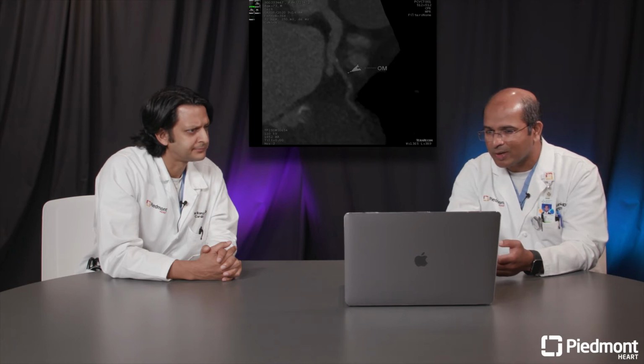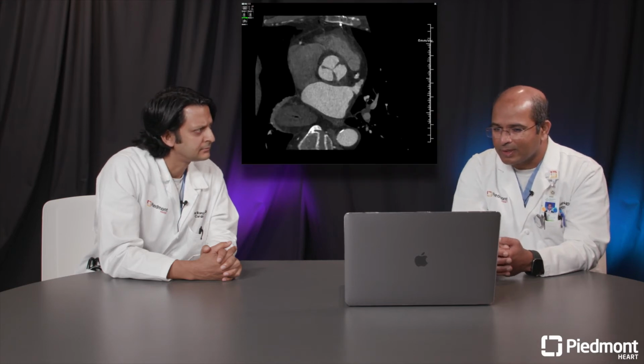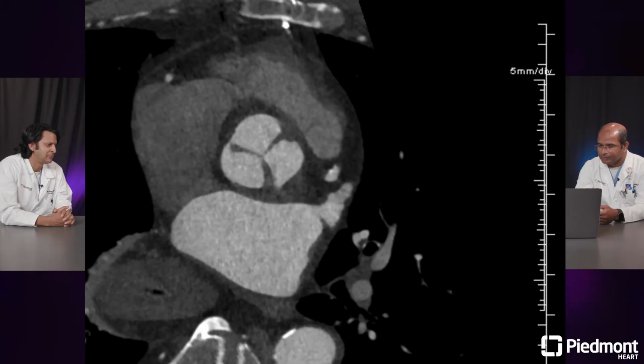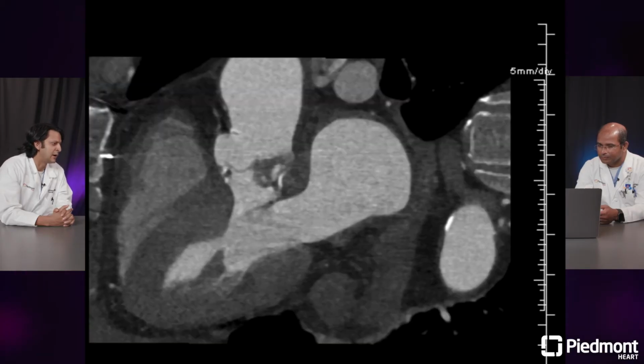And the second case you have here is another bioprosthetic valve, I think, too, right, Vibhav? That's right. And this is actually an outpatient that was having recurrent bacteremia and also some TIA, stroke-like symptoms. And so the question was, was there a thrombus or a vegetation on the valve? The echocardiogram prior actually didn't show any significant vegetation or thrombus on the valve.